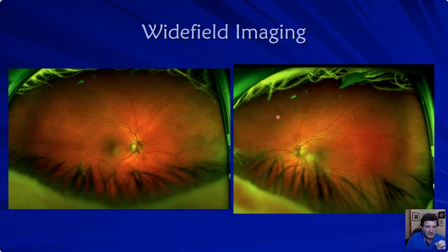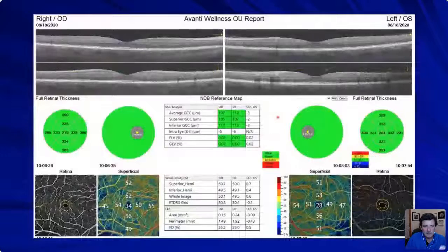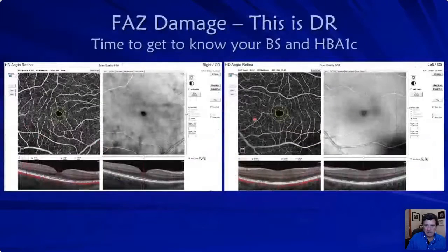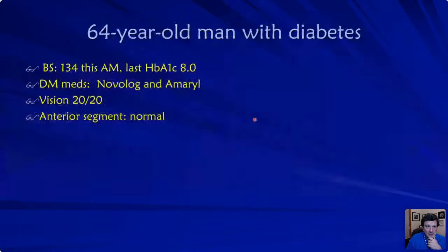We'd say, oh look, the patient is 58 years old. We did a dilated fundus exam. We did wide field imaging. We did some B scans on them. No diabetic retinopathy until you have this technology where you can see that they have diabetic retinopathy. Again, it complements exactly what you're doing with the B-scan type of technology that's out there.